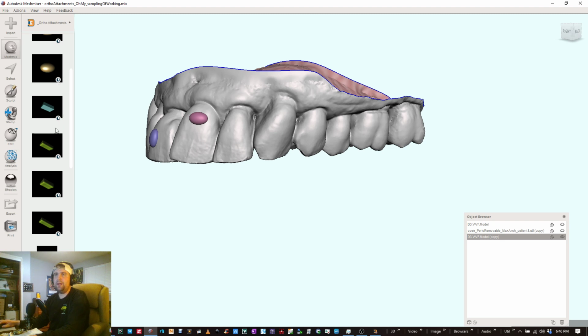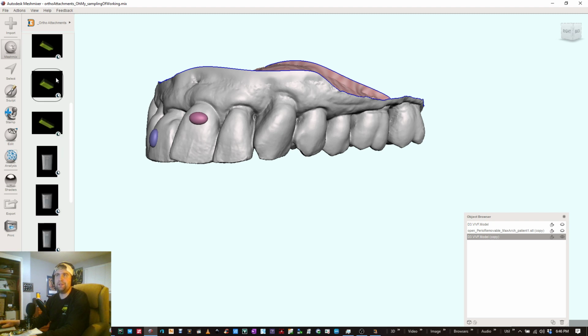And then you have the rectangular, and these ones come in the flavors of standard, which means there's no bevel. Beyond that, the standard ones can be either sharp or rounded, so they have a sharp or rounded edge to it. Then you can go down and you can see on these other ones, there is an actual bevel here.